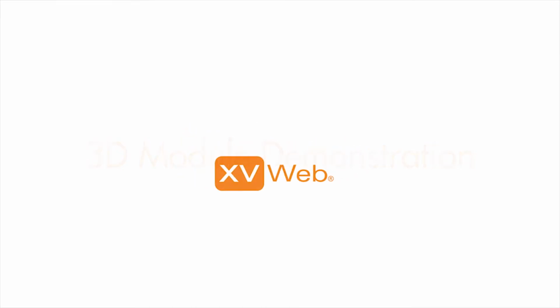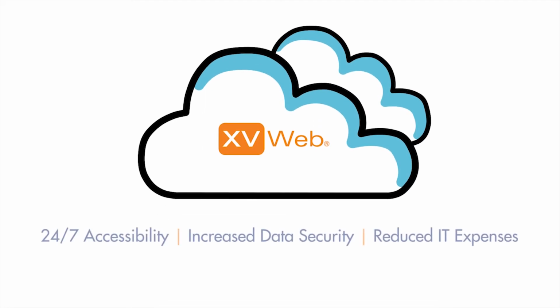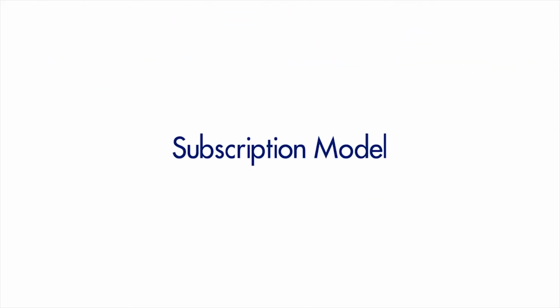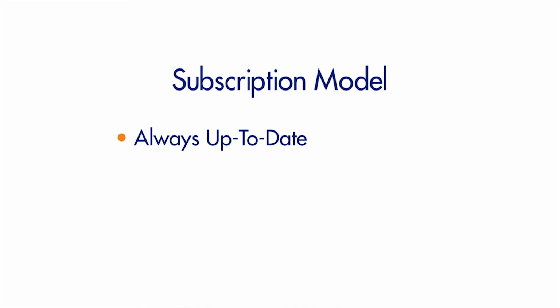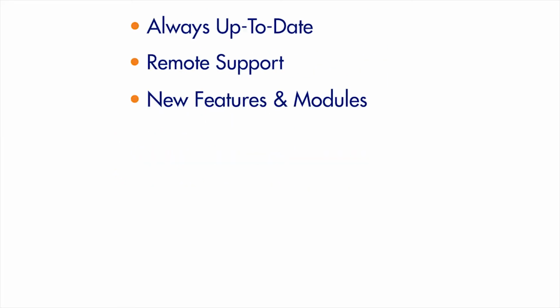XVWeb provides cloud imaging technology to your practice, giving you increased accessibility, data security, and the ability to reduce IT expenses with reduced hardware requirements. XVWeb's subscription model ensures you always have the most up-to-date software versions as well as remote support, with a growing number of additional modules and technologies being released regularly.